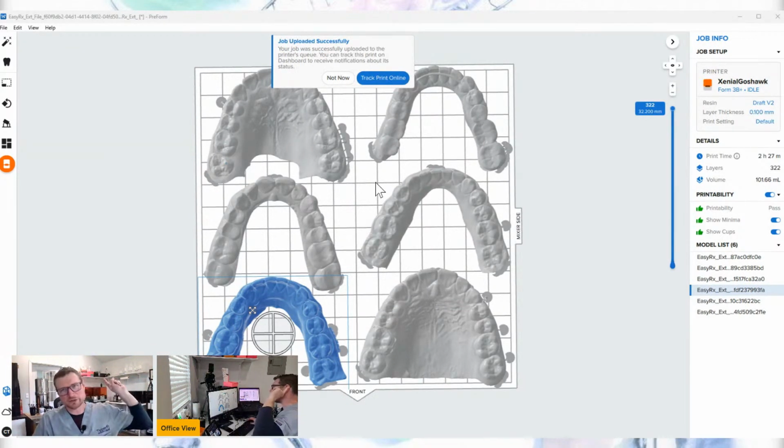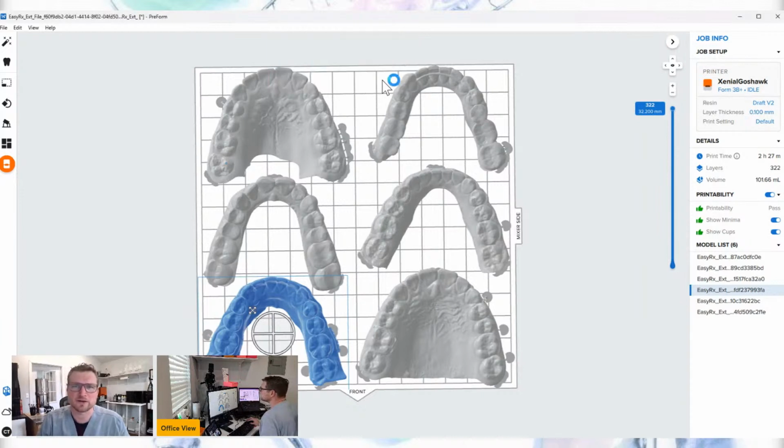I have actually uploaded it. I can actually hear it turn on. The Form 3, you can prime it, and you can remote upload prints to it. So you prime it, you get it ready. You can upload these prints to the Form at your house, or at the lab from your house, which is great. So you can do some of this work at home and send it there, and you can track the progress online.